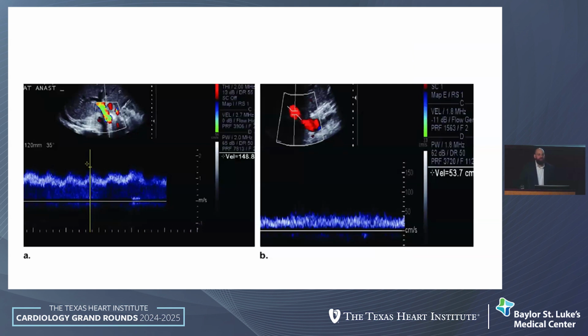Here's a very good example. On the left was a patient who was admitted with septic shock, got over-judicious fluid resuscitation, and you can start to see that the patient has now pulsatile portal vein flow, and that's consistent with central volume overload. They happen to be on 5 of norepi and 0.02 of vasopressin as well. When you see that patient, you know that that is excess volume that's not contributing to stroke volume.